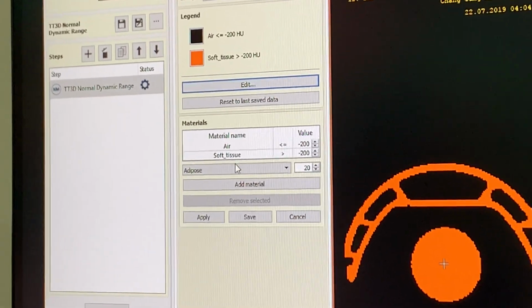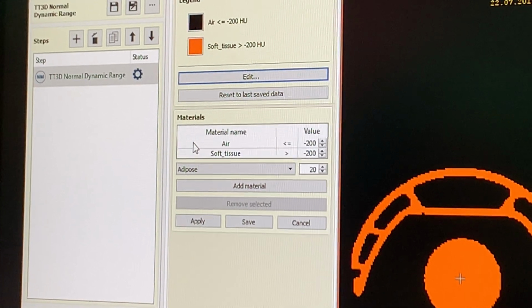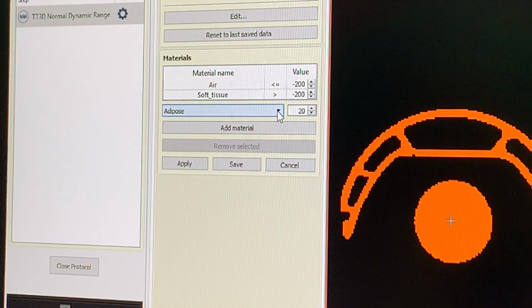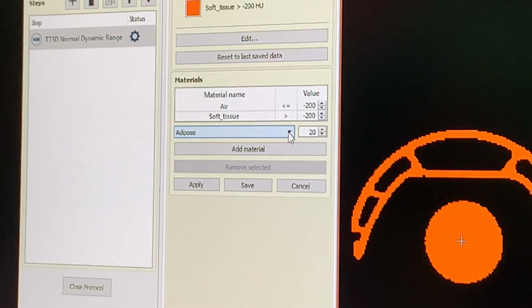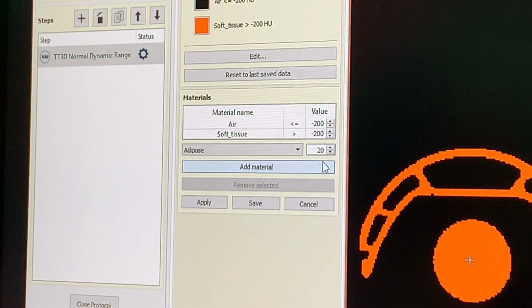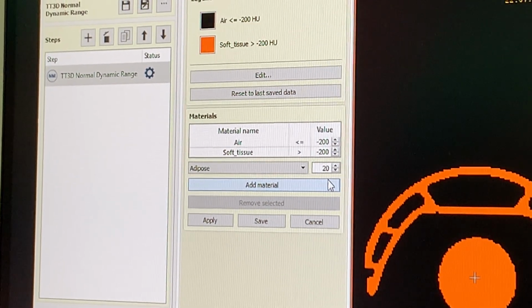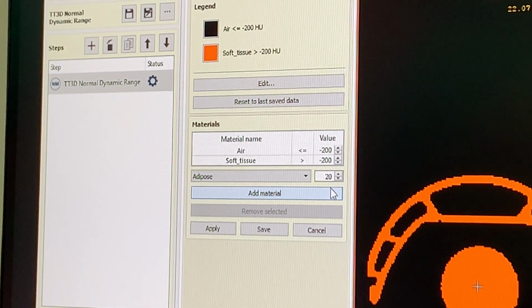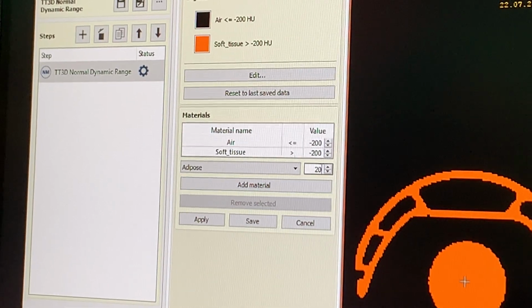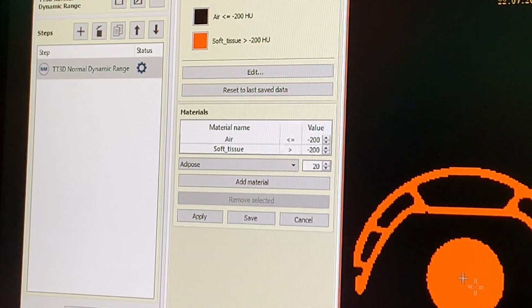I don't really use this frequently, but there are different types of tissues, and you can set up different kinds of thresholds which the system will use. It's much more sophisticated in the case of PET CT systems, because there is a range you can set up. Here it's only one threshold, so I don't really think it is useful.